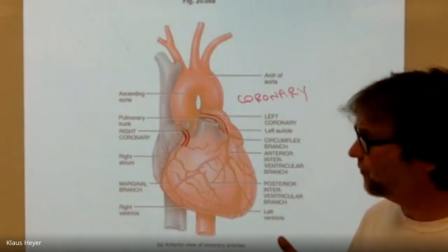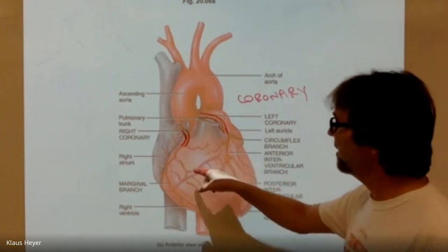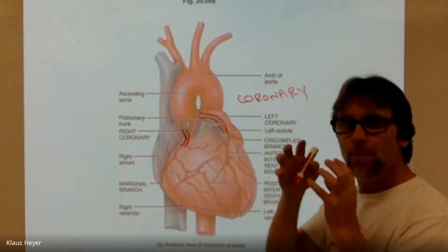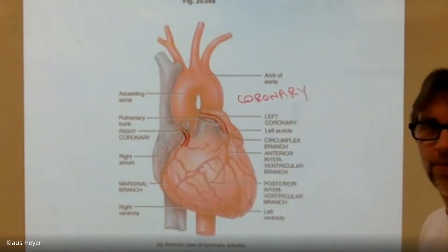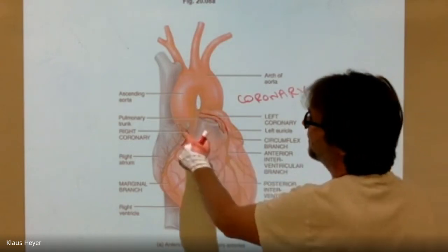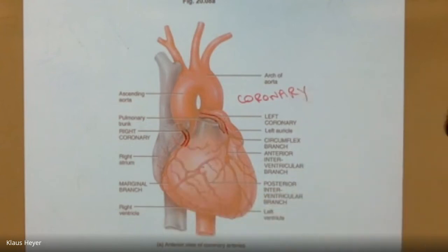let's look at the arteries first. These are all coronary arteries. That's the heart feeding the myocardium. All these arteries are sticking into the myocardium, the muscle, and feeding it with oxygen. And it's all coming from here. See these two, left and right coronary arteries.